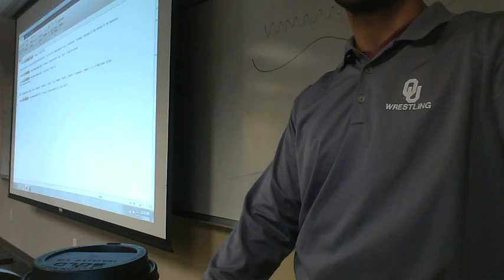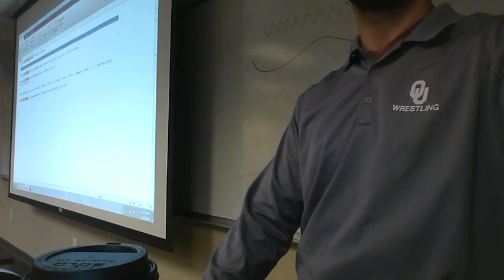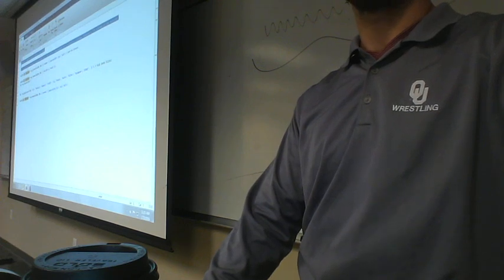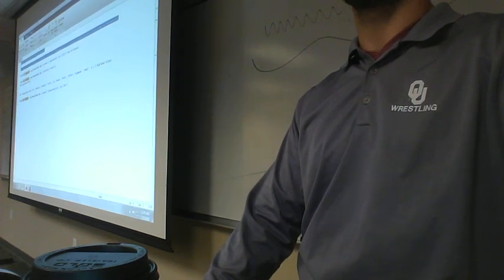Let's say I need to rerun things. Let's bring up, I don't even need to press the EEG Lab button, let's bring up that script. What do I mean by rerun it? That was the question. Let's say that I just want to load that data in. I will highlight this, and if I press the button F9, it means run, or I can just hit the run button, or run section, and when you do that, it will evaluate that.